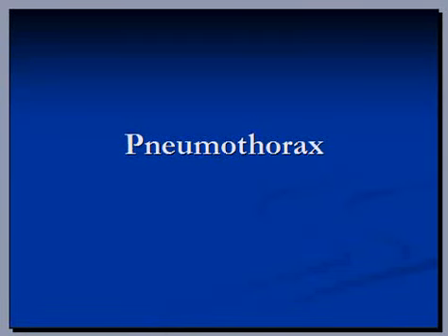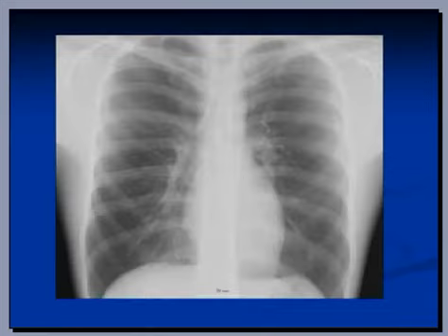Pneumothorax is the condition when air enters into the pleural cavity either because of trauma or because of excess pressure on lungs. The lung as a result collapses in such a case, either partially or completely, depending upon the amount of air that has gone into the pleural cavity.